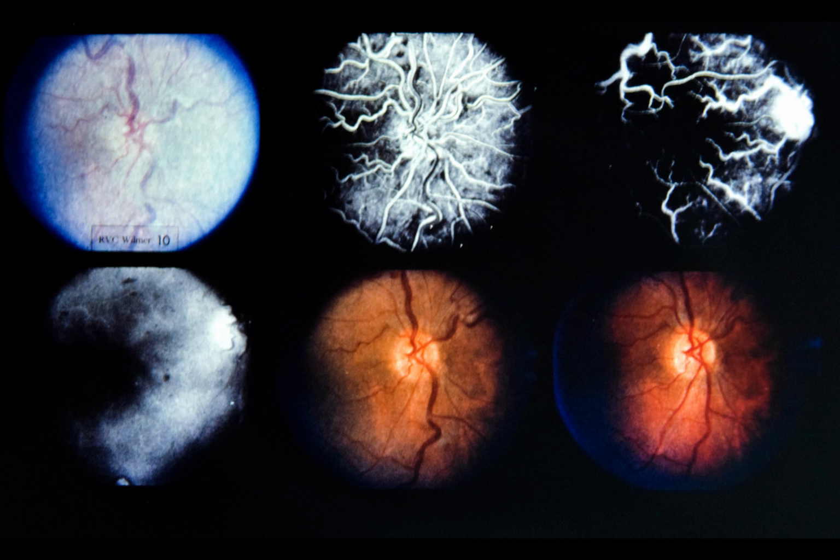Lower center photograph, taken 2 weeks later, shows marked reduction in venous tortuosity and reduction in number of cotton wool spots. Lower right, 2 months later, fundus appears normal. Visual acuity remained 20/20 and she was now asymptomatic. Comment: central retinal venous occlusion in young people has been called papillophlebitis and optic disc vasculitis.